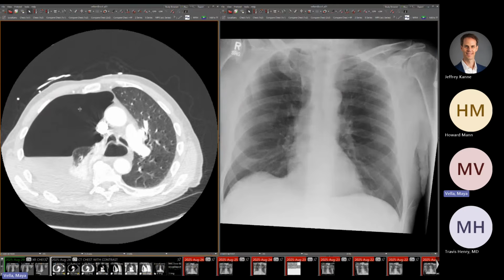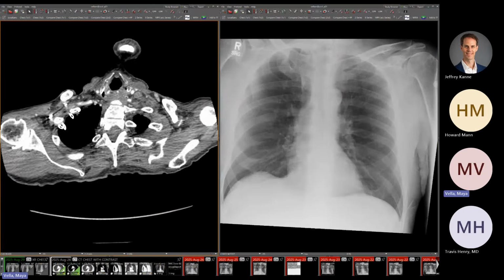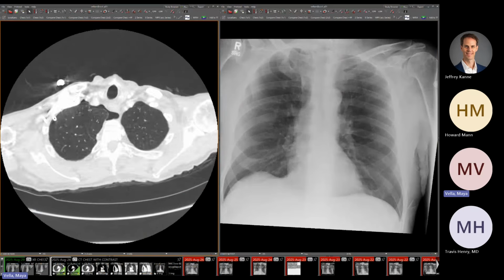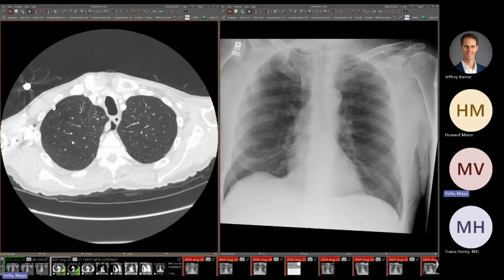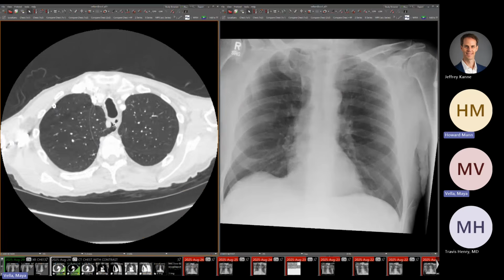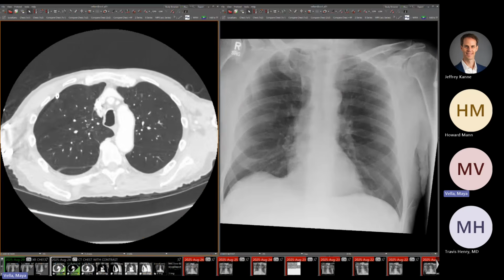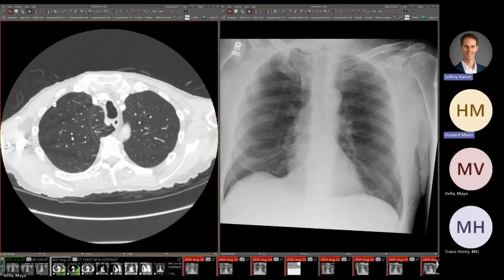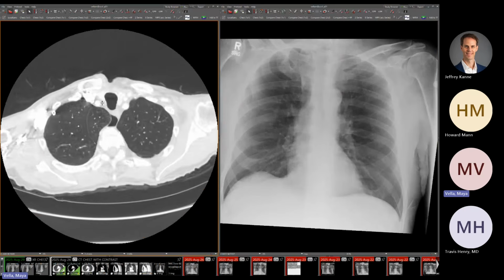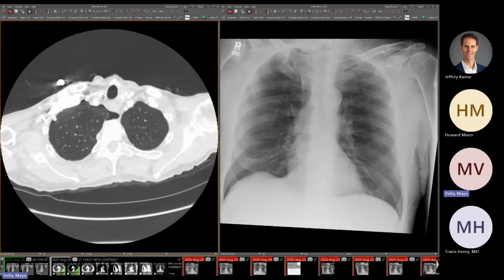And so very large hydropneumothorax. They treated this with a tube. And after the lung had re-expanded, here's our little azygos fissure, but the azygos vessel itself has actually, when the lung re-expanded, it sort of pushed the azygos arch back into the more conventional position. So it's no longer sort of sitting in its little accessory fissure. It's an escaped azygos vein. Right, yeah. I just hadn't seen that particular change before, and I thought it was a nice example of it.